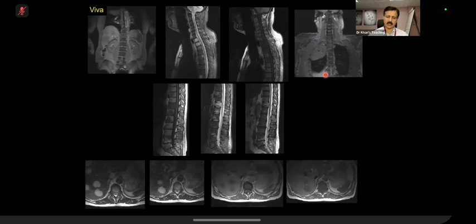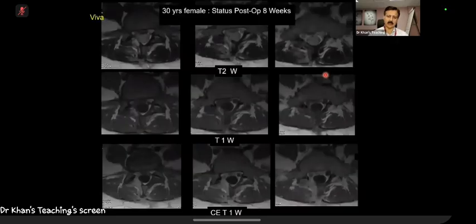So in the spine, for example, you are looking at the cord and something might be sitting in the brain. Or if you go to parasagittal, something might be visible on the lung. So that is what is checked in the exam. Okay, not an ideal sequence because I have not given you a fat saturated post-contrast sequence. It should have been a fat saturated. But having said that, I just want to teach you something here or to ask you something.